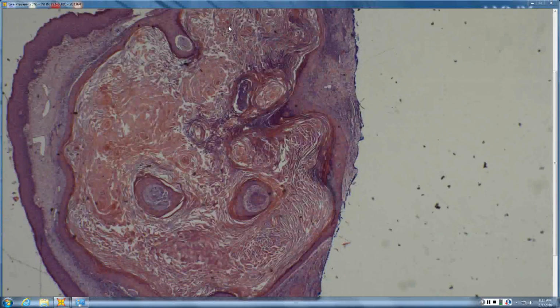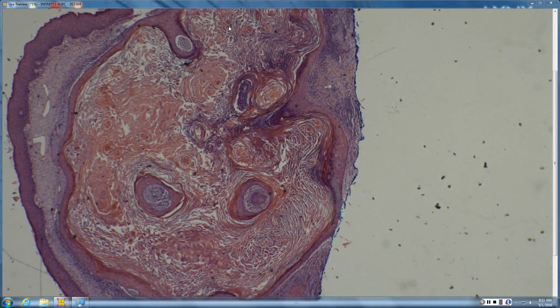And one of the hints often present is there's still elastic trapped in the wall. Right. So it still has elastic trapping from when it was in its proliferative phase. So regressing keratoacanthoma, remember, KAs are basically squames capable of keratinizing themselves to death, and you can trigger that keratinization with things like 5-fluorouracil.